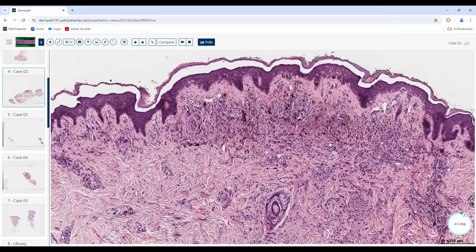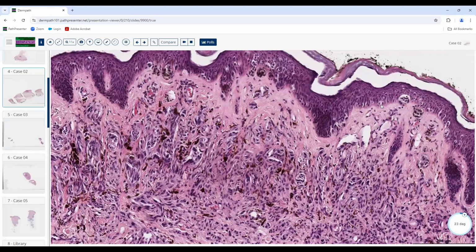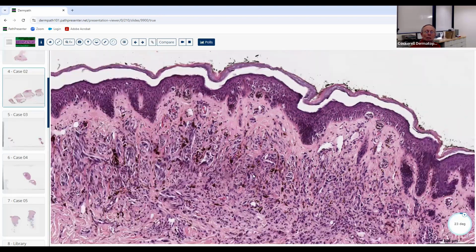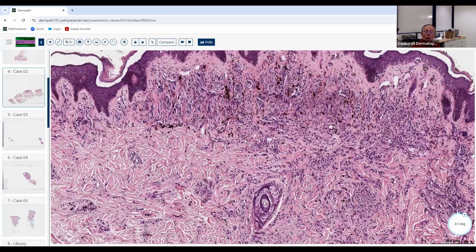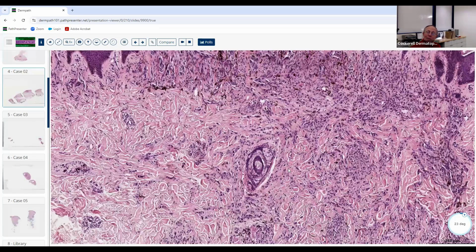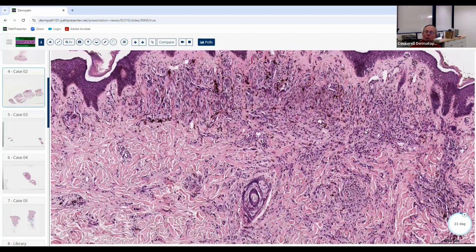There's melanocytes nesting. They look epithelioid and spindled. There's also melanocytes nesting in the junction. Good. There's a junctional component and there's also a dermal component. Notice how it's relatively diffuse in this one area here, and it also goes around adnexal structures and blood vessels. Do you know what kind of nevus, other than a deep penetrating nevus, which is a subtype of this nevus by the way, tends to give you that pattern overall?